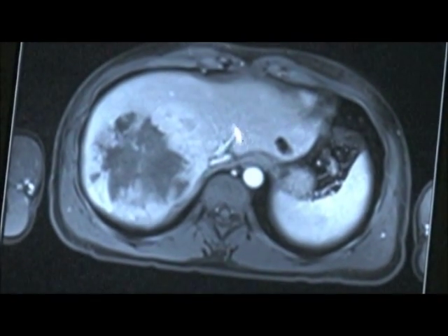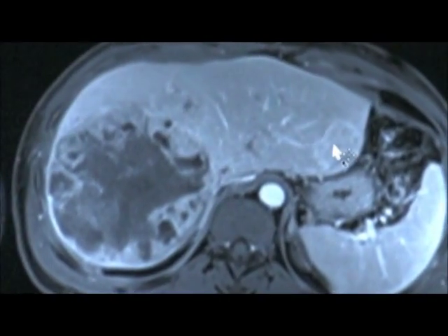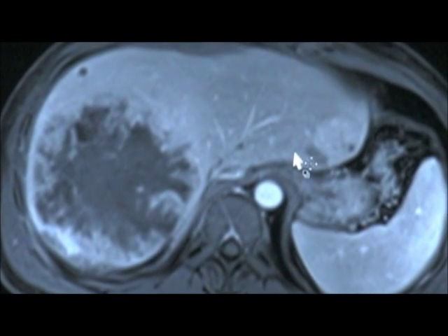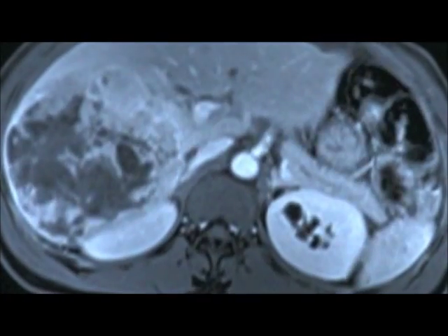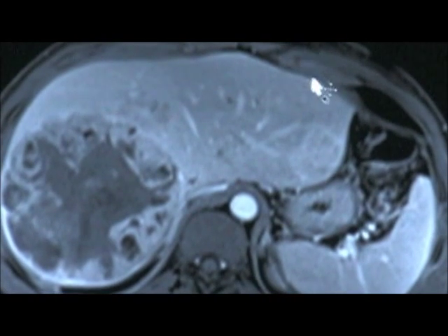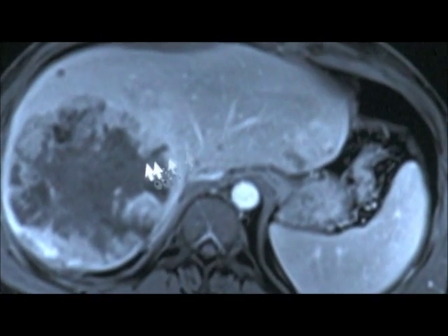And so we have in a transplant liver all of these multiple lesions, and what's also interesting is that we are getting some late capsule enhancement, but many of these lesions are actually retaining some of the contrast, so they're not washing out as we'd anticipate with a traditional or conventional HCC. They're retaining contrast. The other thing that was unusual for hepatocellular carcinoma is that the lesions were moderately bright, as you'll recall, in the T2 weighted images initially. Oftentimes HCC, the smaller ones, tend to be somewhat isointense on T2, but they were relatively bright.